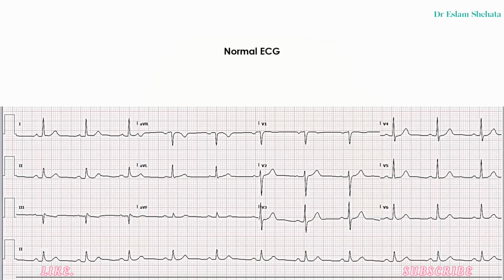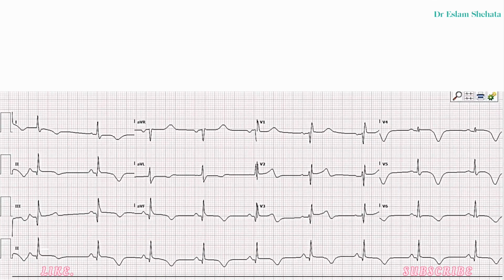Okay, so this here is an example of a normal ECG, which I've included mostly just for your reference. What we'll actually be working through in this lecture series is this ECG, primarily because there are actually some abnormalities for me to point out as we go along.